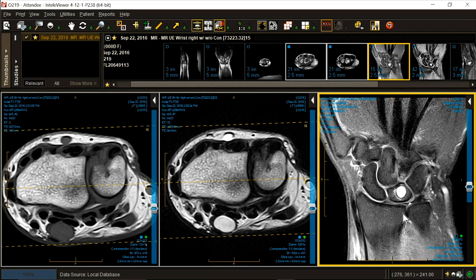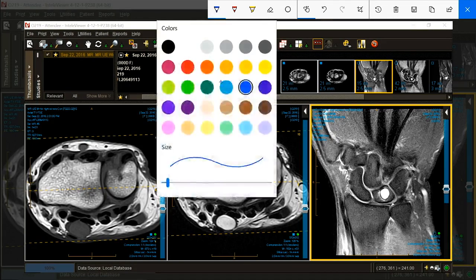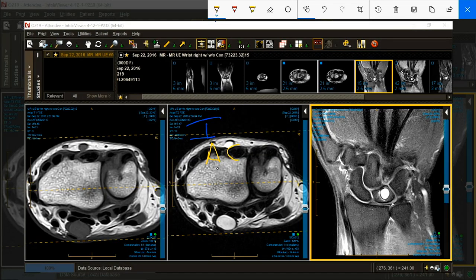We classify our traumatic tears according to the landmark paper of Palmer. So the traumatic classification is going to be 1, and then we're going to have A. A is central, B is peripheral, C is attachment, and D is radial-sided. And you almost never get a radial-sided detachment. In other words, this almost never comes off here. So do not call this a radial-sided tear.